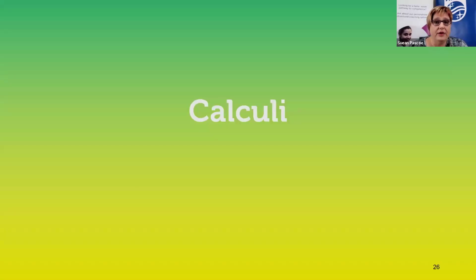So now let's look at those sonographic signatures. And the first one we'll look at is the renal calculi. Often these may be more obvious because if they're causing some obstruction, they get a little bit of water around them, which provides us with a nice window, but we don't always get so lucky. So we're looking for those stones that are bigger than 3 to 5 millimeters. If they're smaller than 3 to 5 millimeters, they're just not big enough for us to be able to generate a shadow.